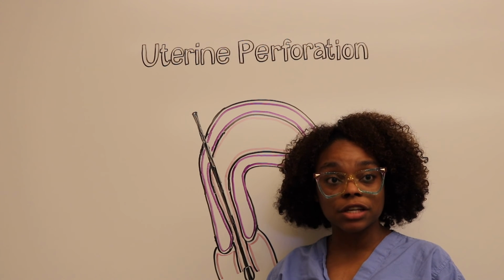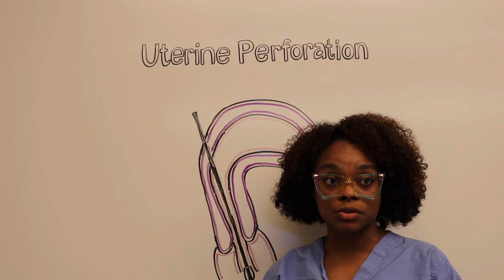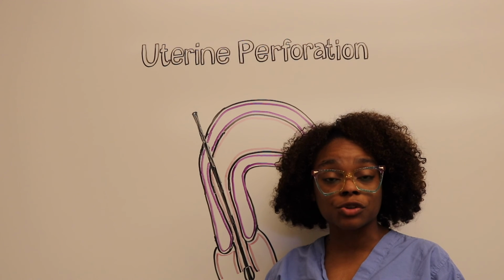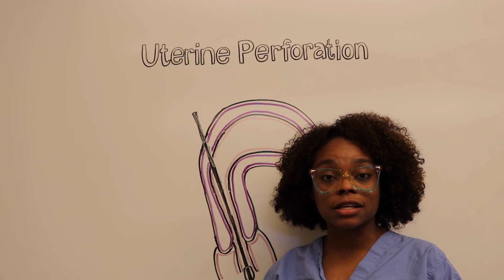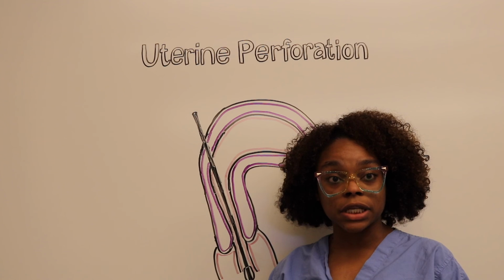Midline perforations infrequently cause morbidity unless laser or electrosurgery are being used. Lateral perforations can damage uterine vessels and cause retroperitoneal hematomas. Laparoscopy should be considered to identify intra-abdominal bowel or bladder injury, manage serosal bleeding, and check for hematomas.